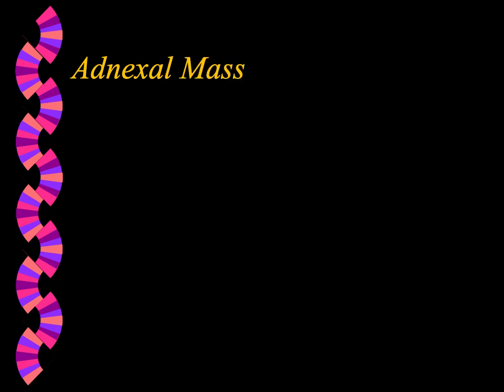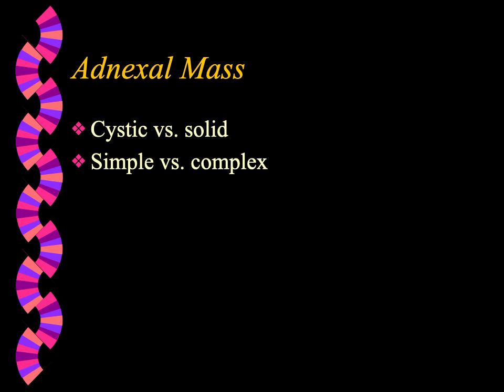Next, we're going to talk about adnexal masses. And some of the key things with adnexal masses are: are they cystic or solid? Are they simple or complex? What is the site of origin of the adnexal mass? And what is the size of the adnexal mass?